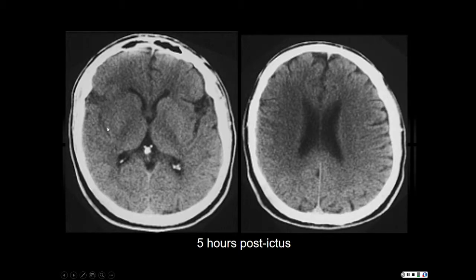So see this little white line here? This little bright density? Let's follow it. Where does it go? Kind of ends right there, right? Let's compare it to the other side. Wow, kind of wraps all the way around. Doesn't it? You can follow it here, kind of follow it in, looks like Lake Tahoe, and then you kind of just follow it forward and around, right? That's the cortical ribbon on the left. What happened to the cortical ribbon on the right? It's effaced. That, Alexa, is the cortical ribbon sign.